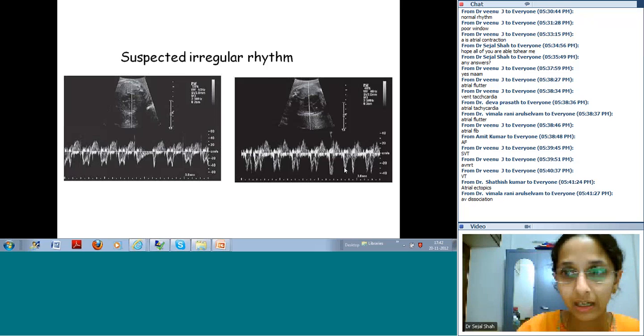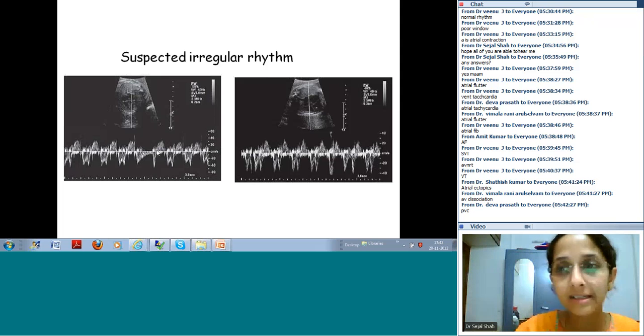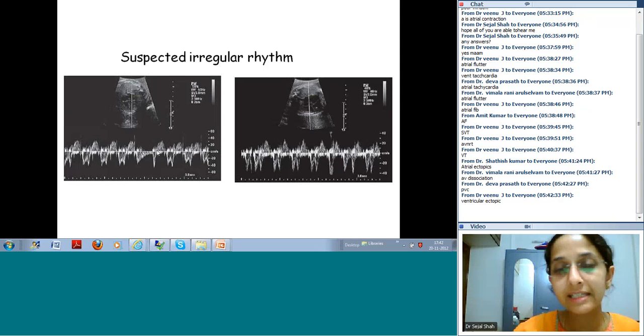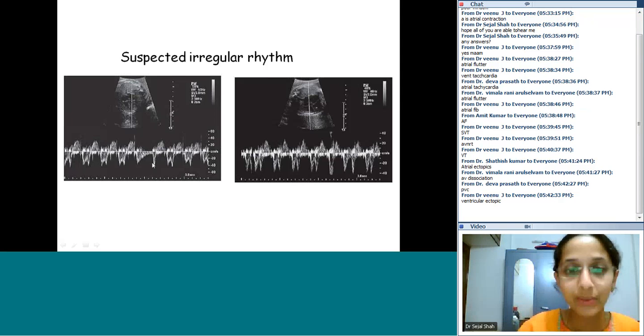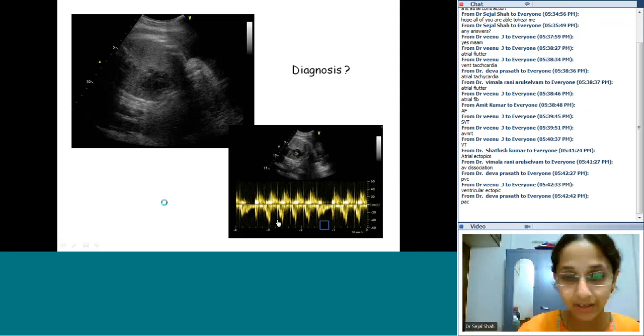So the first picture, you can see it's actually not a ventricular contraction. Why is it not a premature ventricular contraction? We will see it in the subsequent slide. Now if you can see here, this is very similar to what we had seen in the previous figure. This is the atrial activity and suddenly the E wave is seen and then the inflow continues till the A wave, till the next beat where it is conducted as ventricular contraction.